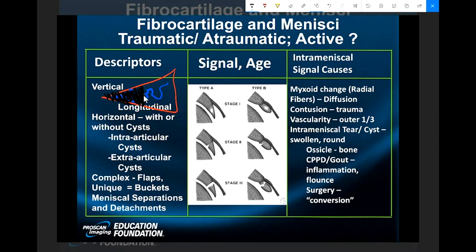Unless it's twisted, unless it's collapsed, unless there's a cyst, unless there's a piece broken off. That is conversion signal of a stable appearing chronic meniscus tear. Or you could say stable appearing chronic signal conversion type of a meniscus tear combined with normal myxoid intrameniscal signal or normal intrameniscal change of aging. You can word it any one of a number of ways, but you got to word it as a do-not-touch-me conversion type signal phenomenon in the middle to outer third of the meniscus.